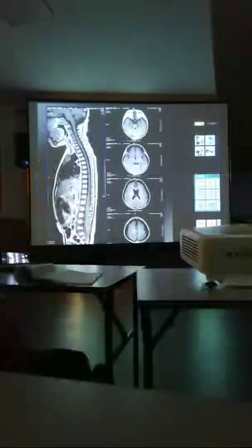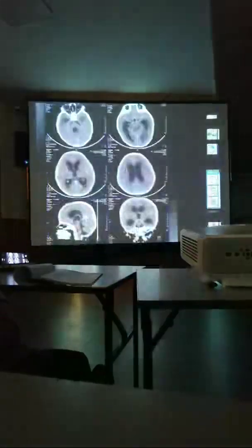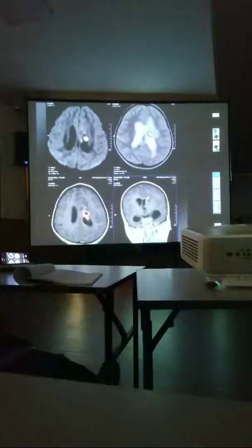You can see the brain exudates are there, subarachnoid spaces are involved, bright signal lesions, and in the spine also the conus medullaris and cord infarction. It's a craniospinal meningitis, arachnoiditis. So always please screen the spine also whenever you are referring for this. This is a typical manifestation of hydrocephalus. This is the complication. You can see the exudates in the basal cisterns presenting as hydrocephalus. And choroid plexitis and intraventricular abscess, you can see the diffusion restricting lesion, and it is the typical appearance of enlargement as well as enhancing choroid plexus.